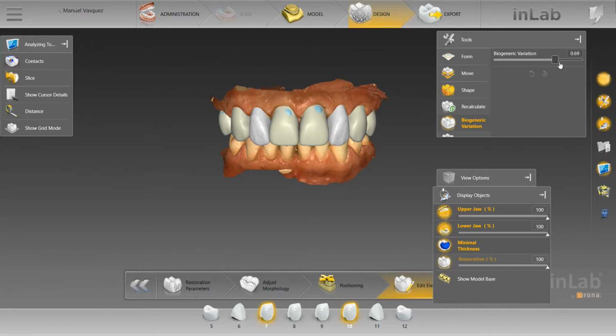This is a male, so we want to take that into consideration as well. You can see all the options as I run through this. Stop about right there.